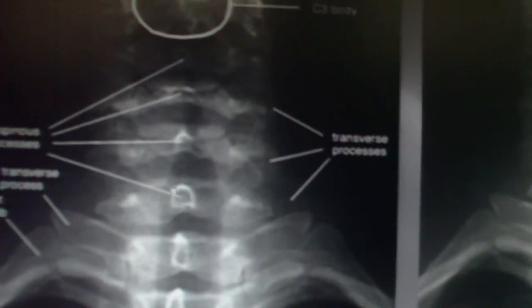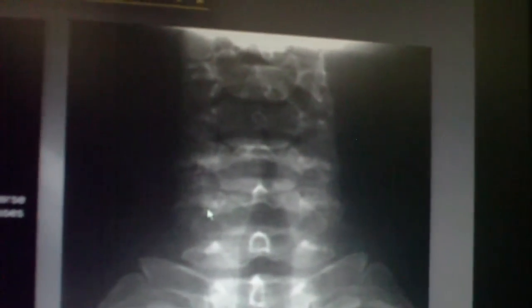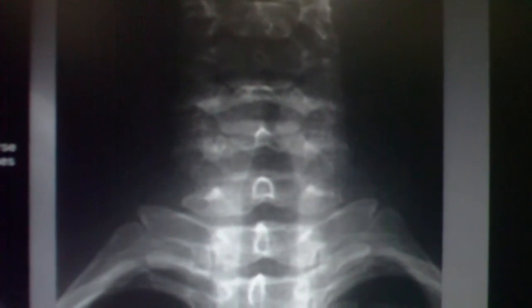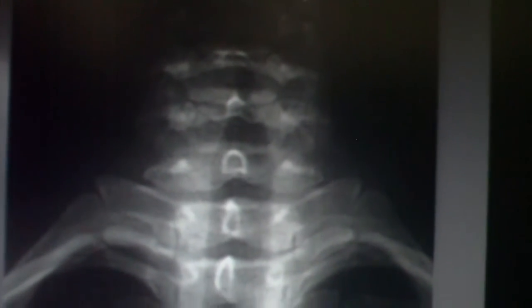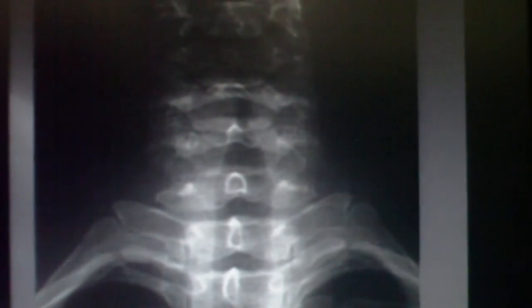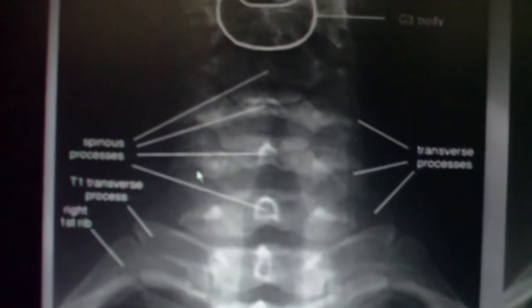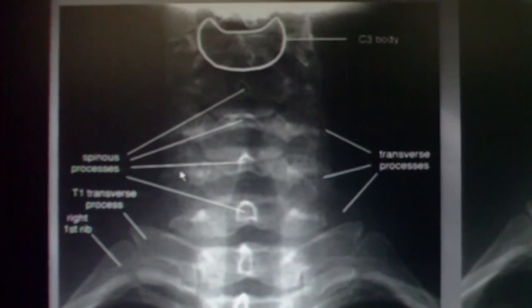Okay, please, people were still telling me that these lines here were vertebral arteries. You never ever would see them because the plaque that would be in the vertebral artery isn't dense enough to predominate over the density of the articular pillars, right? So those have to be the laryngeal cartilages. That includes the thyroid, cricoid, arytenoids, all that kind of stuff, right?